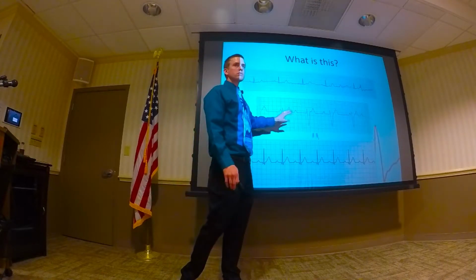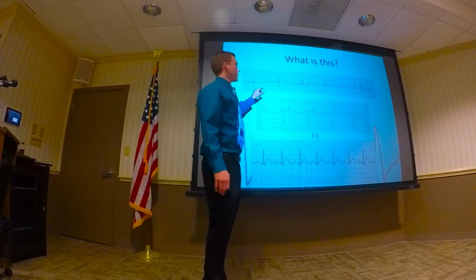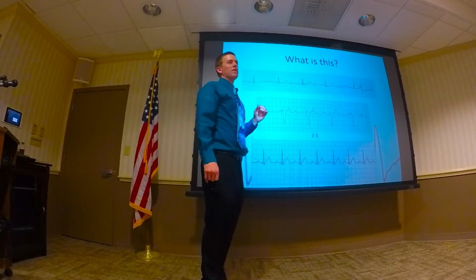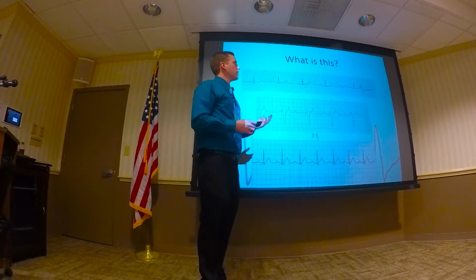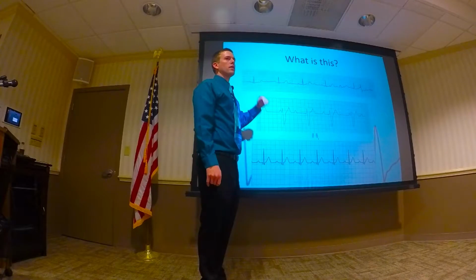So what would you call that then? This would be AV dissociation, incomplete AV dissociation. I would probably list in the chart as like a high degree AV block. You can't say for sure if it's a type 2 or type.